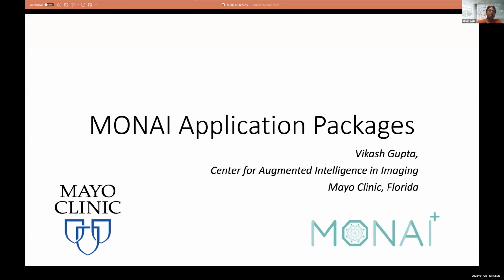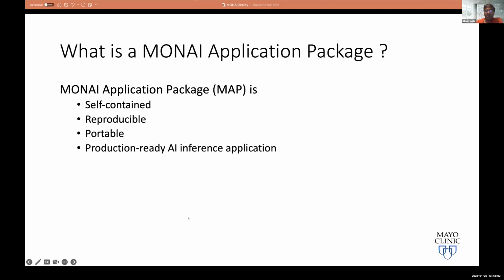Now that you know what all can be done, I am going to delve a little bit deeper and show you some of the capabilities of MAPs. I will also try to show some of the code, so when you go back and look at the GitHub, you know where to look and what to find, how to build your own MAPs. It will make your job a little bit easier. So that being said, let me go to the next screen.